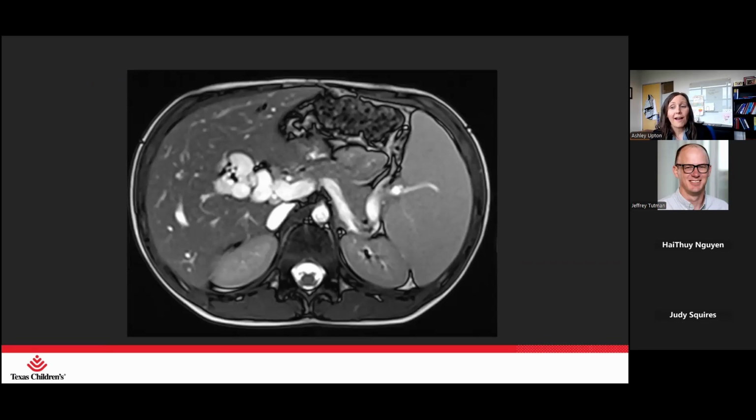And this is an MRI of a patient with chronic main portal vein thrombosis and cavernous transformation. I think it's impressive how tortuous these collaterals become over time, as well as how large they can get. And this is an axial view at the liver hilum, showing tortuous collaterals extending from the head of the pancreas and going into the liver in a patient with known chronic portal vein thrombosis. The bright vessels at the liver hilum represent the cavernous transformation on this MRI.